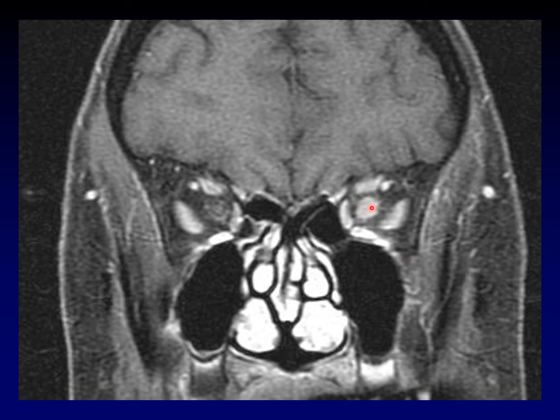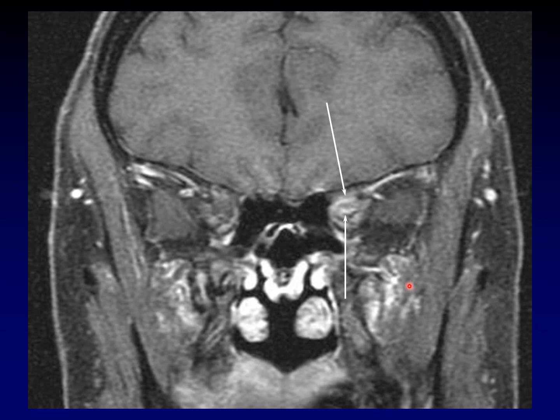peripheral mass crushing the nerve centrally, or is this a central mass pushing the CSF out? Well, the problem here is we're in the center of the lesion, it's hard to tell. If you go to the periphery of the lesion, here's where you can see that in fact there is enhancement around either side of a preserved nerve. It's hard to appreciate that on the last slide in the center of the mass because the nerve is so crushed down by the mass itself, but when you get to the edges you can see more clearly that this is actually a meningioma.